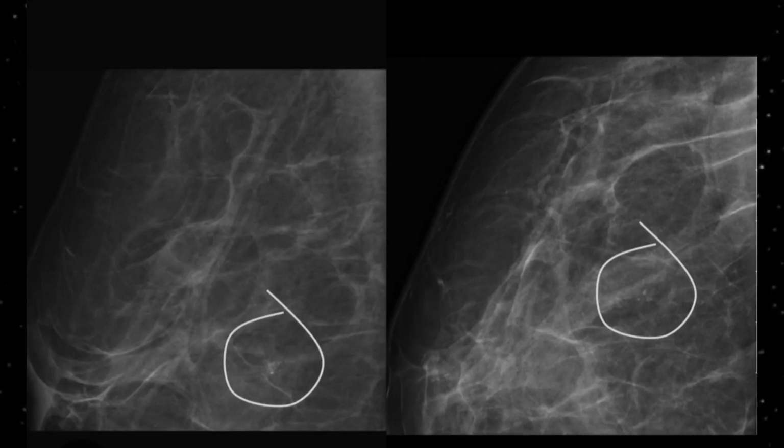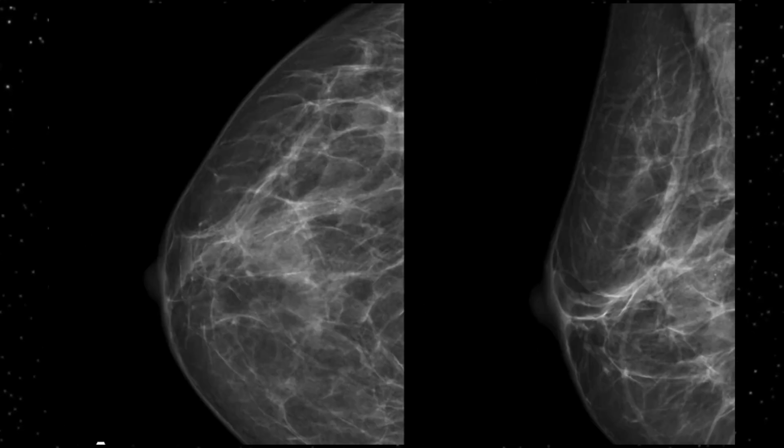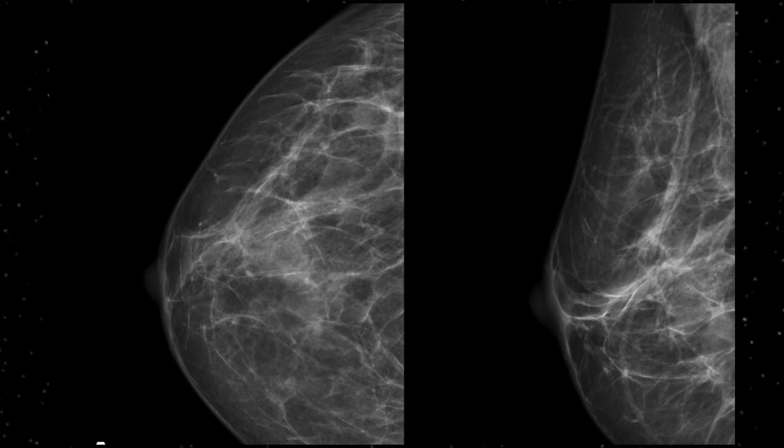This will give rise to, but for that, as we mentioned, you have to have the craniocaudal view and you have to have the true lateral view. But on that image which is visible to you, it shows a characteristic feature of the fibrocystic changes and sedimented milk of calcium within the microcysts. On this mammographic view, again you can see this sedimented milk of calcium within the microcysts. It will appear like that, the way you are seeing on these mammographic images.